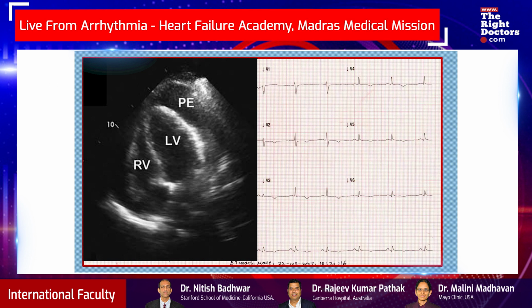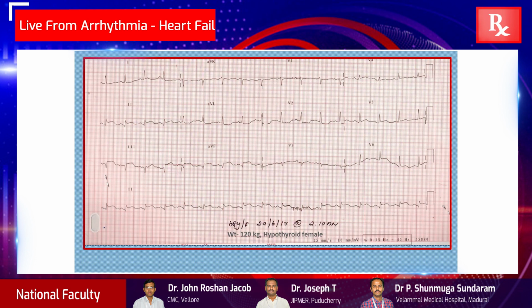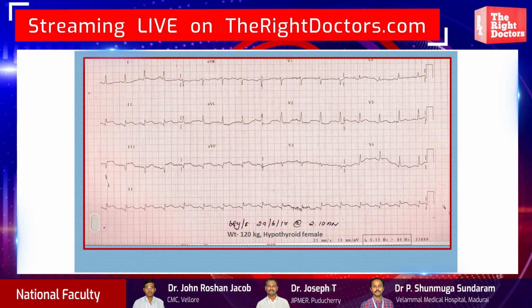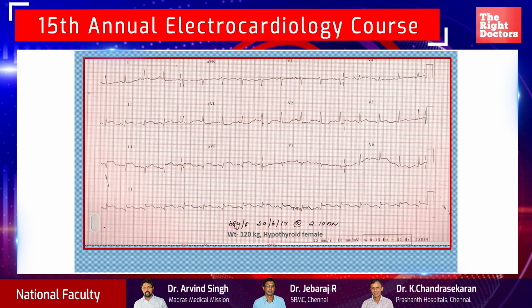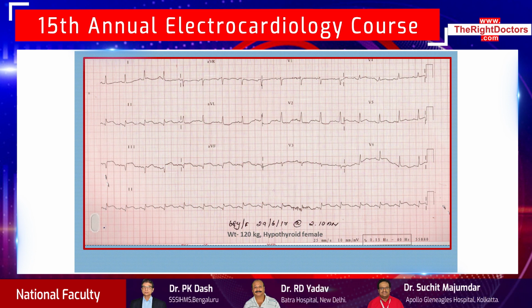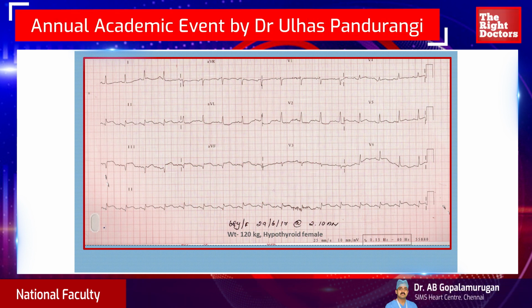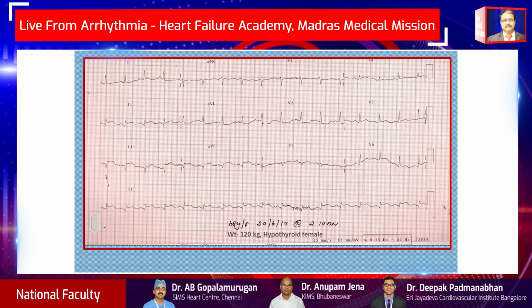This is another ECG of a patient with, again, a pericardial effusion showing low voltage complexes, especially in the limb leads. So you should also see the history that's written on the ECG. You can get clues from the age of the patient and some other history that you can find written on the ECG. So this was an obese, hypothyroid female. It's no wonder that the complexes are of low voltage. In addition, the patient presented, of course, with a delayed presentation of an inferior wall myocardial infarction. You can see the changes in the inferior leads. Q waves with ST segment changes, ST segment elevation.